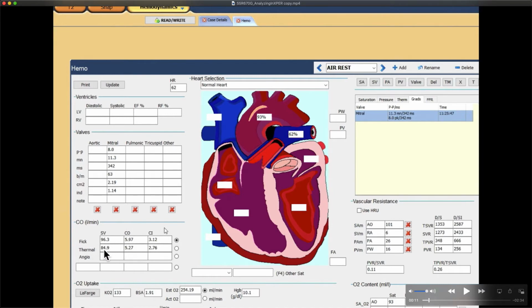So in most cases, thermal dilution is the optimal measurement for the most accurate stroke volume through the valve in question. Fick refers to generally the assumed Fick based on the estimated oxygen consumption, and that has been studied extensively and is not accurate enough to give you an accurate valve area. Only a ballpark estimation, unless you get the metabolic cart, bring it down and do a 3-minute recording and get the actual VO2, plug that in, and that would be the measured Fick, which is the gold standard.